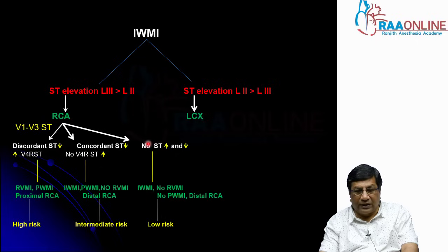Whereas there is no ST segment elevation or depression in your lateral leads, as well as no ST segment depression in your anterior leads, and there is no ST segment elevation in V4R.